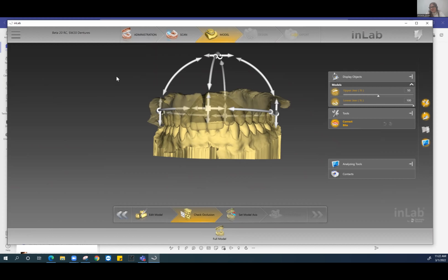Again, I recommend pausing this video and practicing for maybe 20, 30 minutes. And then Jonathan Verroche is up next, and he will take you through the workflow for a complete over complete denture. I do recommend for your first denture case to try a complete over complete. The reason is that it is a really simple, easy, pre-occluded workflow in the software. So it'll make it that much easier to learn the steps.